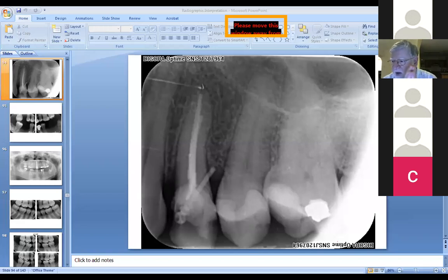But when they're buried, leave them well alone. All those patients you saw the resorption on, the teeth dissolving away, were elderly patients. It had been happening for quite a long time.